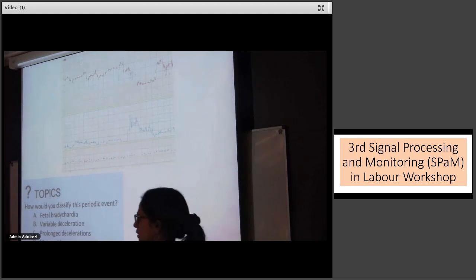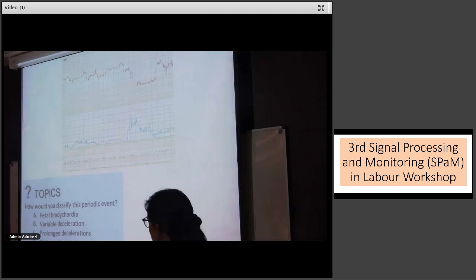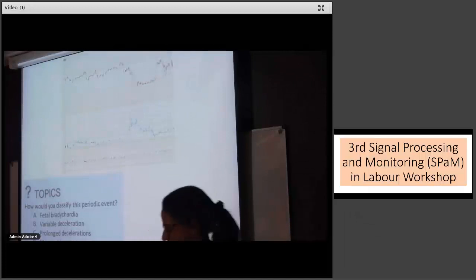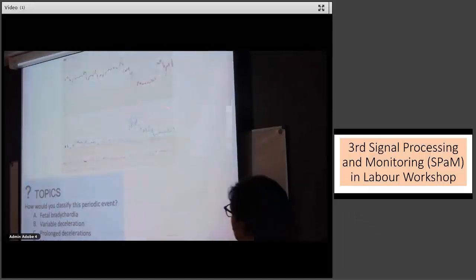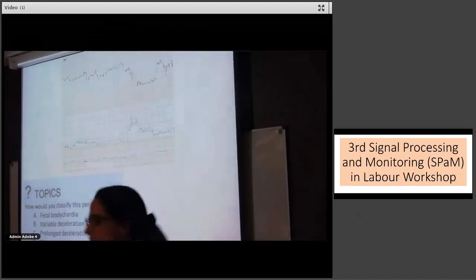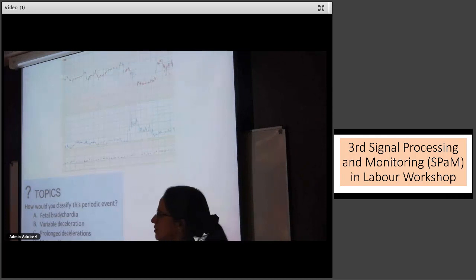Right. Is that the maternal heart rate at the bottom? No, this is ECG. Oh, right. This is ECG. But even with ECG, we can sometimes. Oh, yeah, but not for 3 minutes. No. Okay. I was wondering if there was anything explicit in the FIGO guidelines about maternal heart rate and why you would say it's not. Well, there is, but this is with the scalp electrode. All of this is with the scalp electrode to get the signals. Okay.